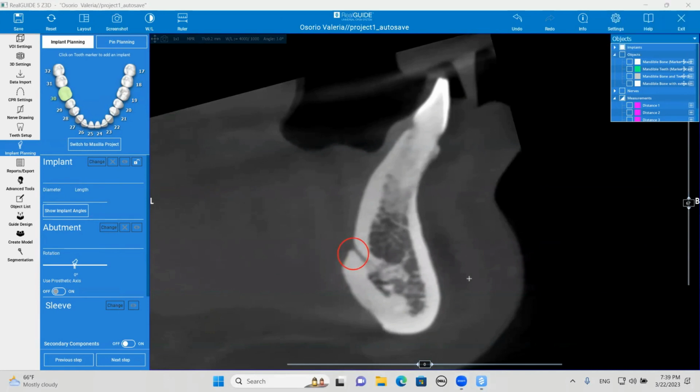Okay. So what he circled there is called the mandibular lingual vascular canal. And the opening on the lingual aspect of the mandible is called the lingual foramen. Inside that lingual foramen is what is called the vascular canal. It's usually the midline lingual vascular canal. It's almost always on the midline. What it is, it's the right and left sublingual arteries, and they anastomose right in that area.